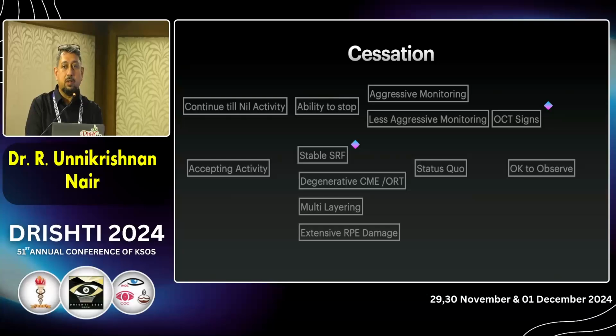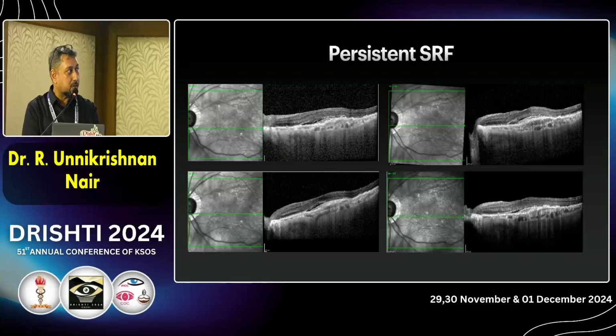Or by your treatment, if the RPE atrophy, that is whether you're getting fluid going away or not going away, if you see that RPE atrophy is increasing, you should be careful about over treating this patient. You may have a dry fovea, but you'll have RPE atrophy and severe visual loss. So this is what I talked about, persistent fluid.